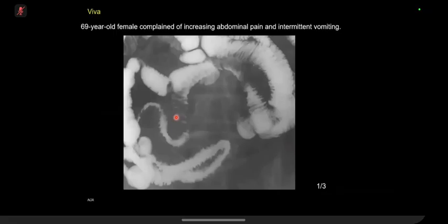Can you describe this? Yeah. So I'm presented with a barium meal follow through, and I can see that there is a long area in the terminal ileum which is narrow with thickening in that area, and proximal to that there is some bowel dilatation as well, and mucosal fold thickening.